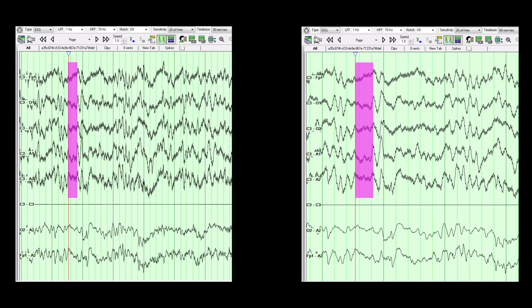Yet, with the digital EEG, since it collects all information using one common reference electrode and the different montages are mathematically reconstructed, it seems that 60 Hz interference does not appear to be more prominent with longer inter-electrode distance, as you can see in this record.